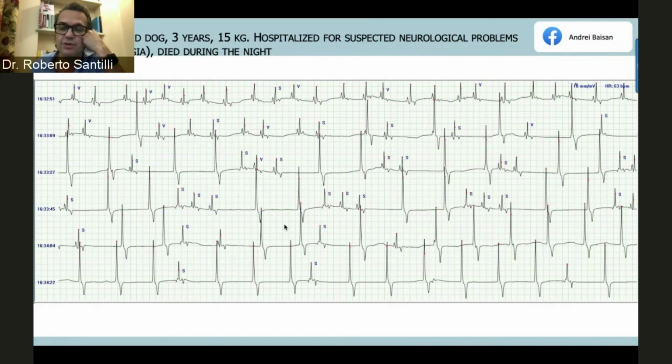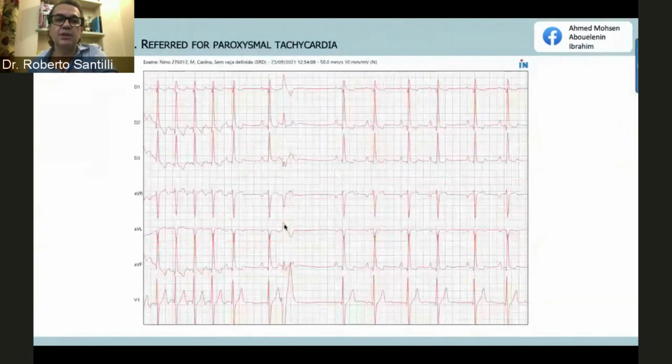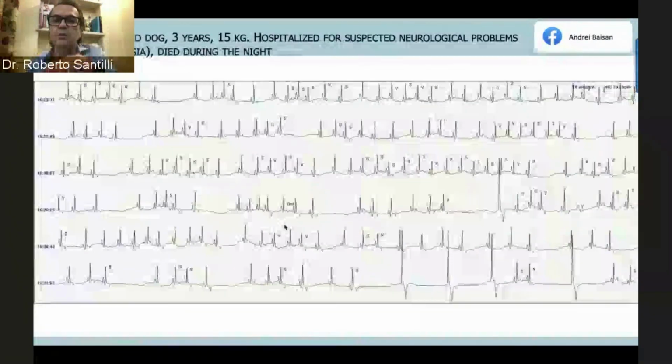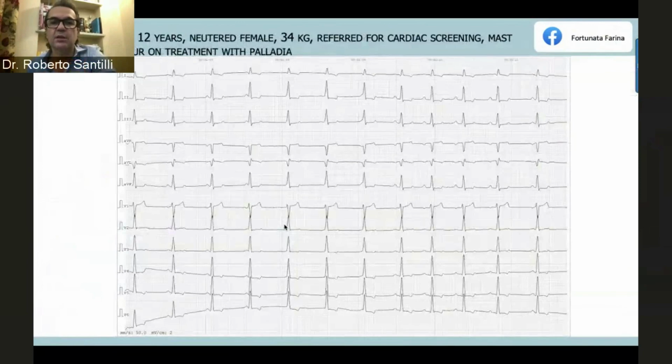Very interesting. Unfortunately, we couldn't review all of them, so there is this one, and maybe we will do it next time. And there will be also another one, an isorhythmic atrioventricular dissociation, but we will do that next time.